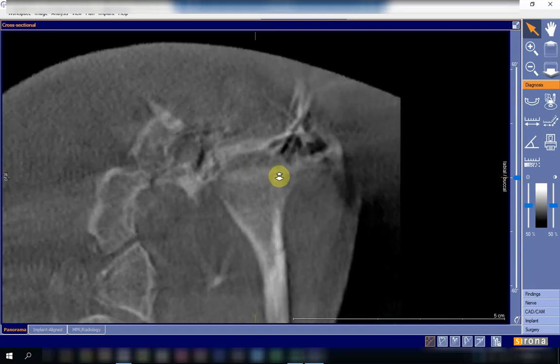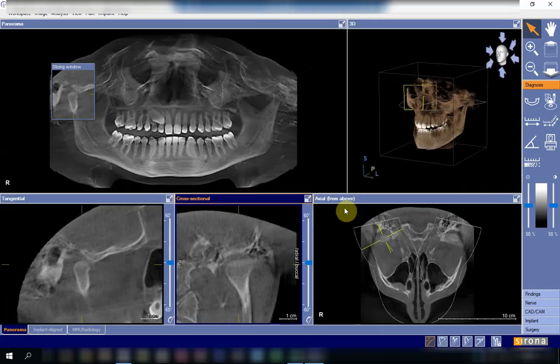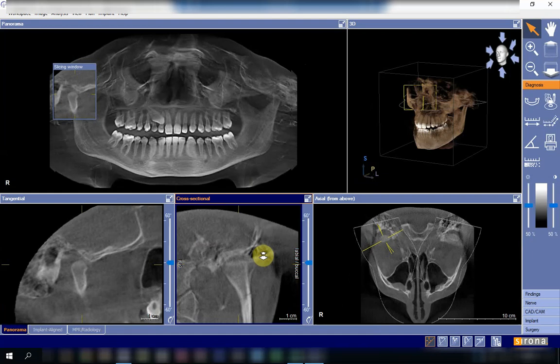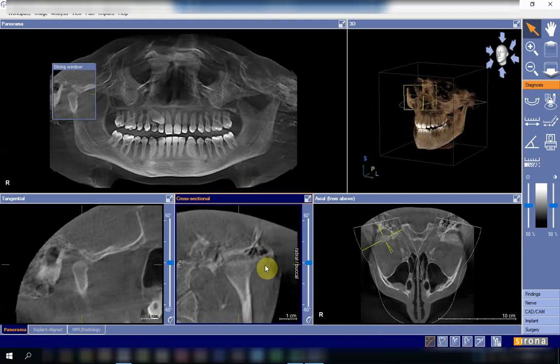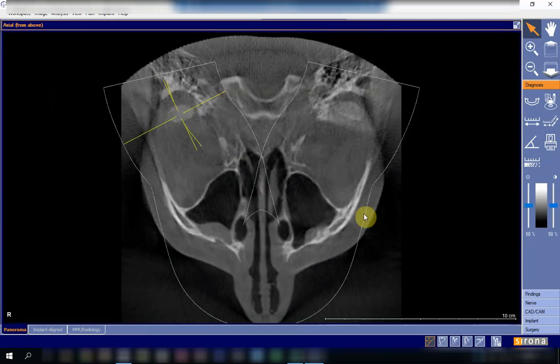Just like when we were in the lateral view, the same criteria are followed, but in an anterior location. Okay. The last view to look at is the superior surface, or the axial view. This is the view from the top.